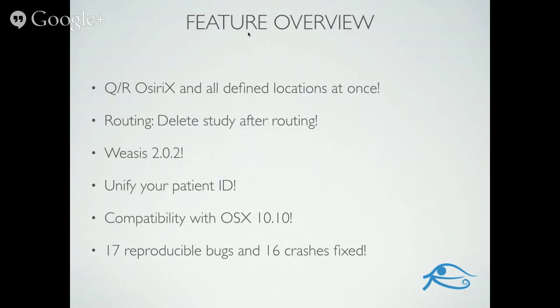And we'll talk a little bit about how that works and how you can make best use of that. If you're using OsiriX to manage medical imaging workflow in your practice and you're auto-routing studies to other locations, OsiriX now will automatically delete studies after successful routing. We'll show you how to get that set up.